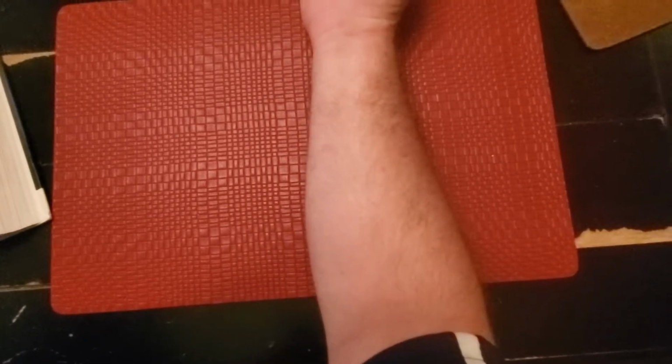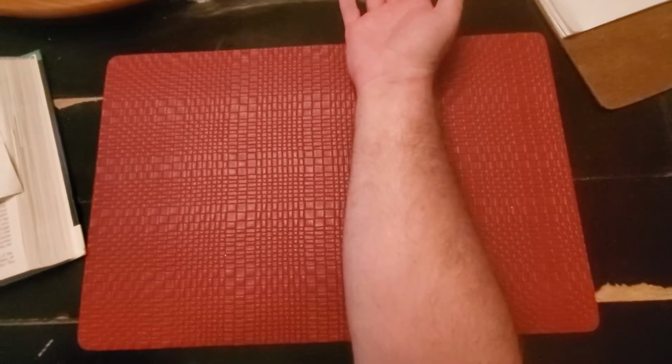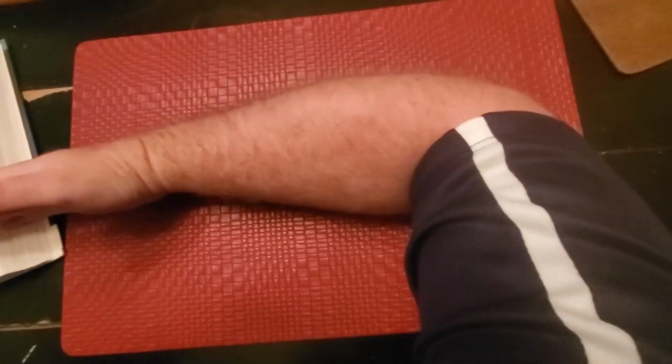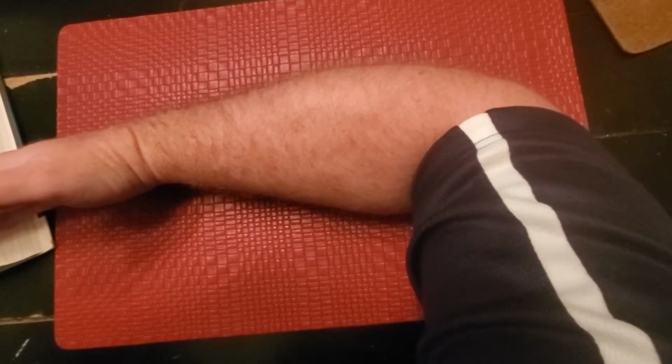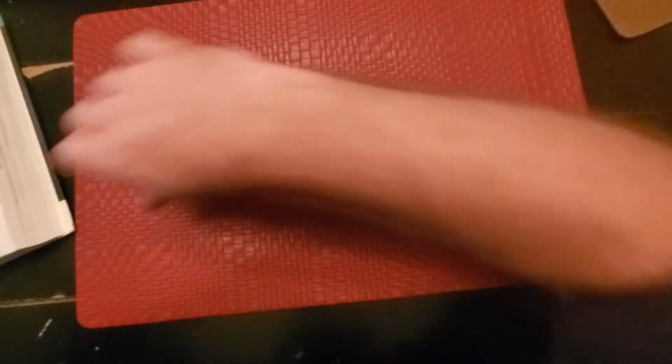If you're doing an arm, position is also needed. If your arm is over cell number 2 and it's supposed to be over cell number 1, or if you're doing a lateral forearm and are supposed to have the center cell activated but not 1 and 2, you would have wrong positioning.